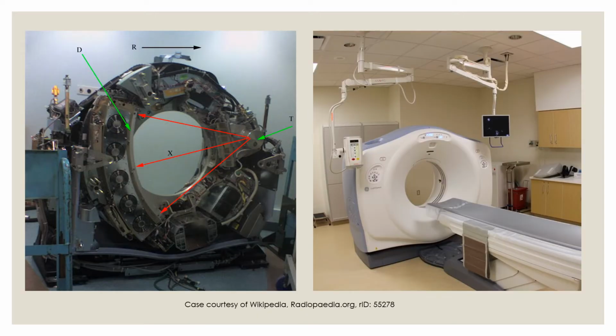So this is what an X-ray is. As we can see, this is what a CT is. We can see that the T is our X-ray tube, which emits X-rays. X-rays are delineated by these red arrows, and then there are loads of detectors arranged in an array here. Loads and loads of detectors, and this whole apparatus rotates. It rotates around the patient as the patient actually moves through the scanner.